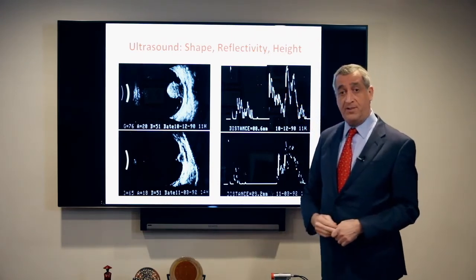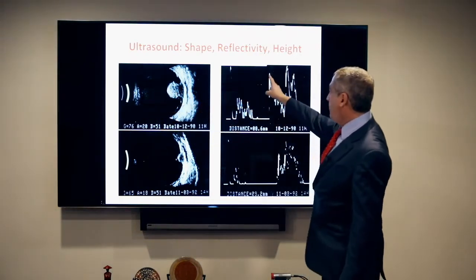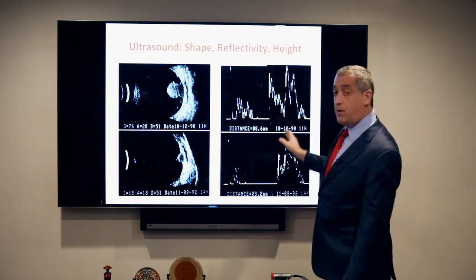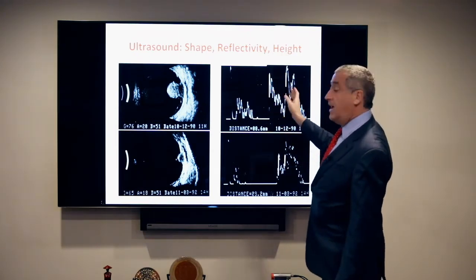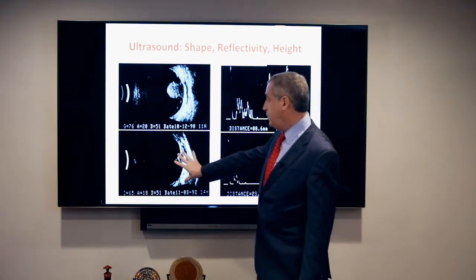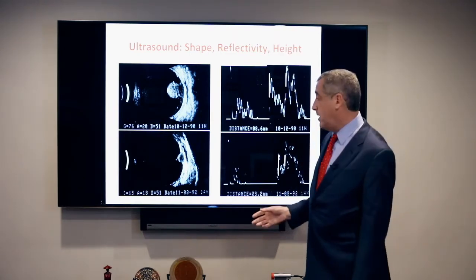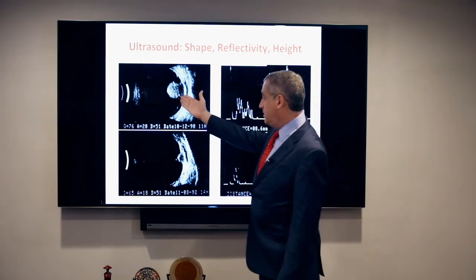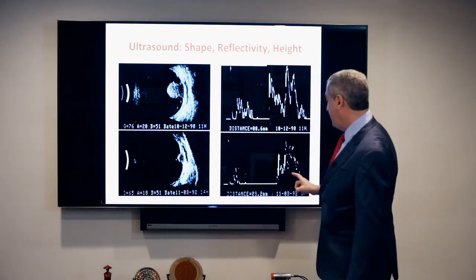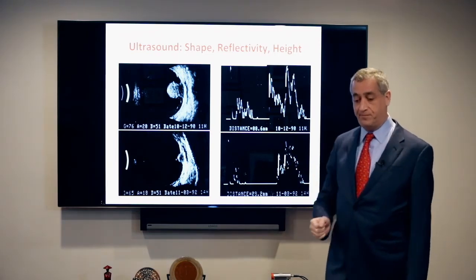So an A scan is like a pencil of sound that runs through the tumor. And you can see that 45-degree angle as the reflectivity goes down at that rate. And that is very classic for a choroidal melanoma. These are pictures of 2 years later after the tumor was plaqued and sterilized by radiation. And you can see the tumor is reduced to a little nubbin. But interestingly enough, it still has low internal reflectivity on the A scan.